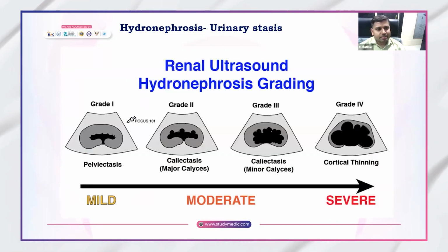So let's talk about some basic pathologies. We'll not be talking in much detail about these pathologies.